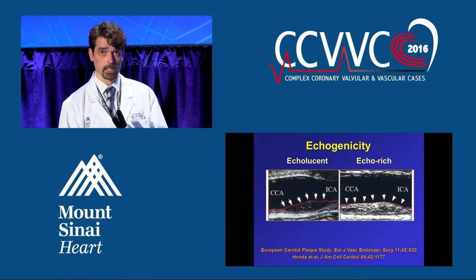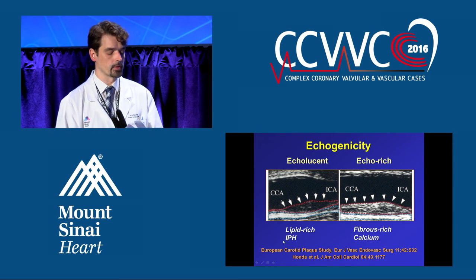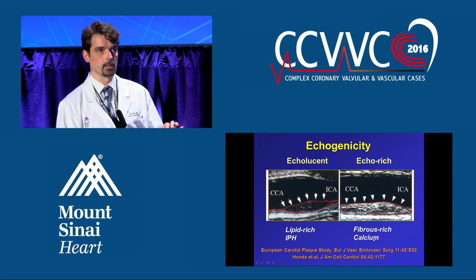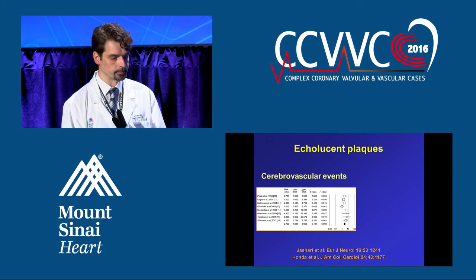And what about the plaque characterization, which is the topic of the talk? So basically, we're looking for the appearance of the plaque as either echolucent, which is this kind of dark plaque here, or echo-rich, which is much more bright. So these two plaques in histology correspond to lipid-rich plaques, sometimes with intraplaque hemorrhage, so with the bleeding inside of the plaque, and these ones correspond to stable plaques, which are fibrous-rich and very calcified. So again, the calcium that is associated with a high-risk plaque is spotty, small calcifications, but once the plaques stabilize, they can have big calcifications, but those are different though.